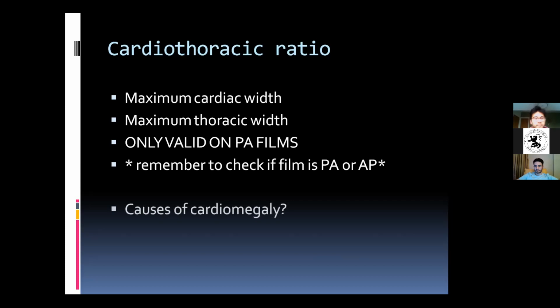Just out of interest, does anyone know any causes of cardiomegaly? Congestive heart failure, good. Any kind of heart failure, left-sided, right-sided, can cause it.